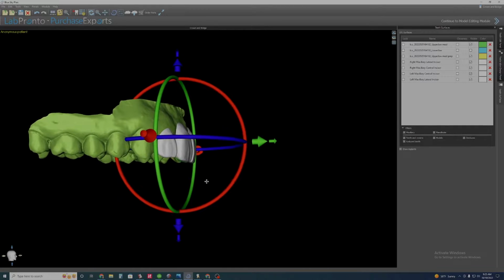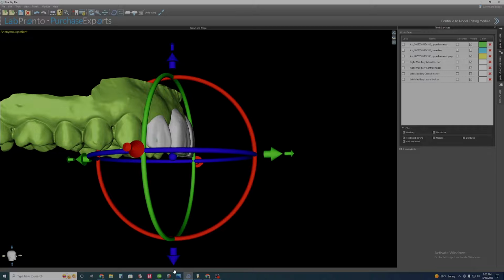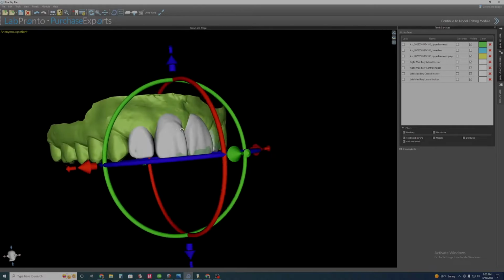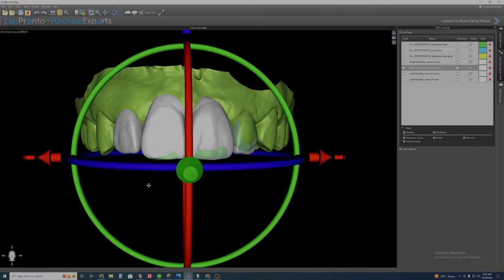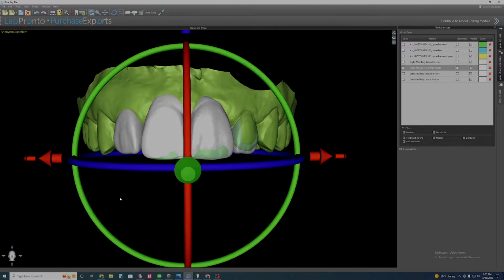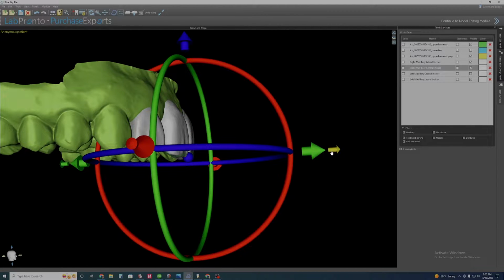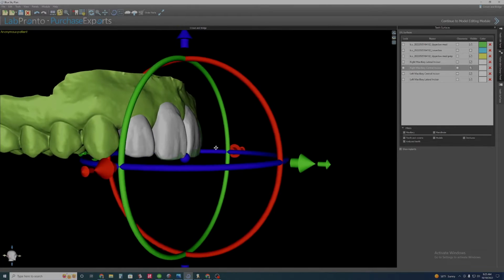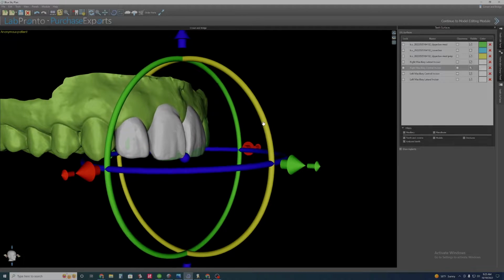One thing that's kind of useful is you can see me use these large arrows to bodily move the teeth. If you use the small arrows, they're going to shift this entire sphere. And so right now, I enjoy the incisal positions as they are. So I don't want those to really change as I mold other features. So I'm going to put this circle right at the incisal edges. So now when I'm moving these teeth or tilting them, the incisal edges are pretty much staying still.